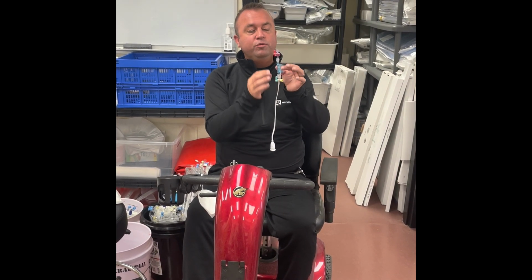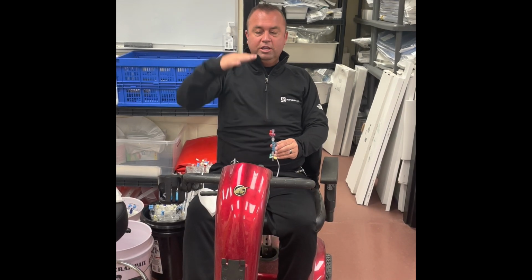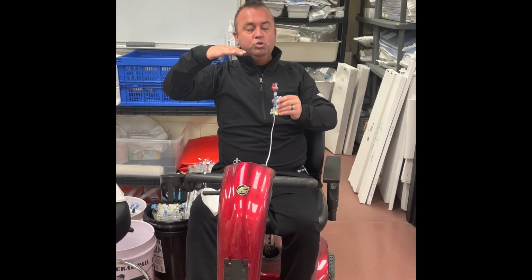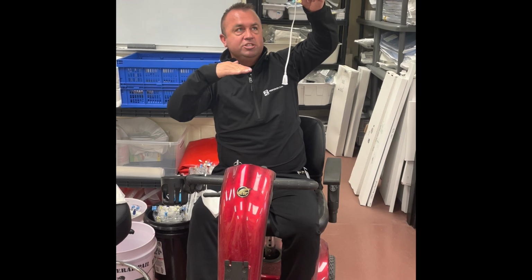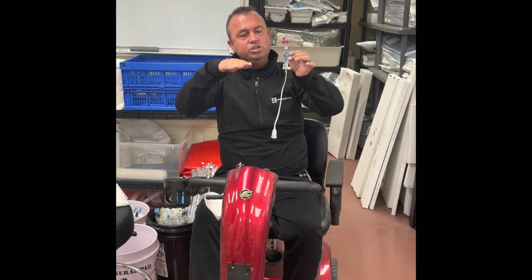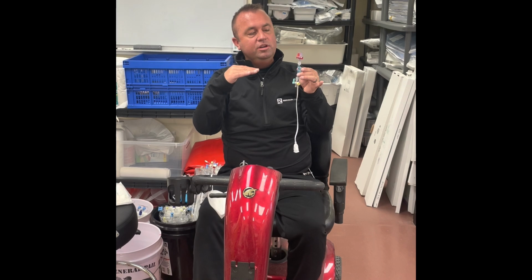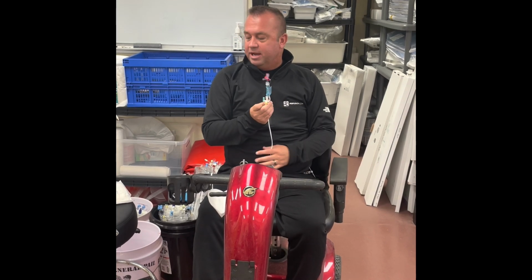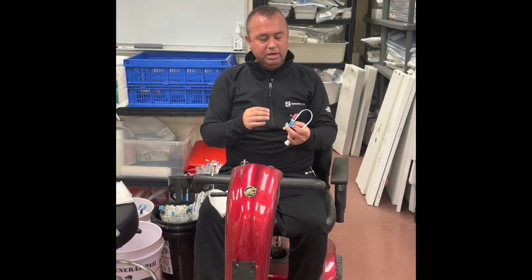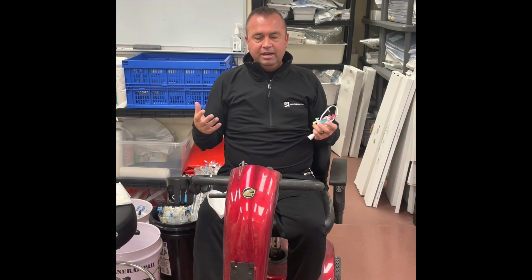If we've zeroed this pressure transducer and then the pressure transducer is lowered compared to the patient, we will get a falsely elevated high pressure. If we raise the transducer in comparison to our patient, we will get a falsely low pressure. So the pressure is only accurate when it is completely even with the patient. A time when this might have an impact is raising or lowering the bed while taking the mammary artery, or if we are moving the patient height versus our transducer height at any given time.